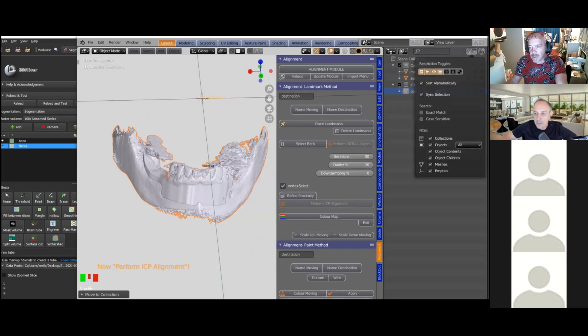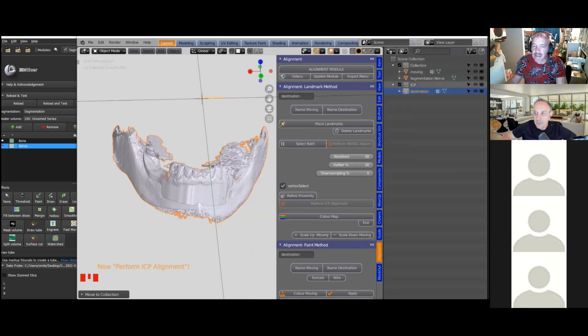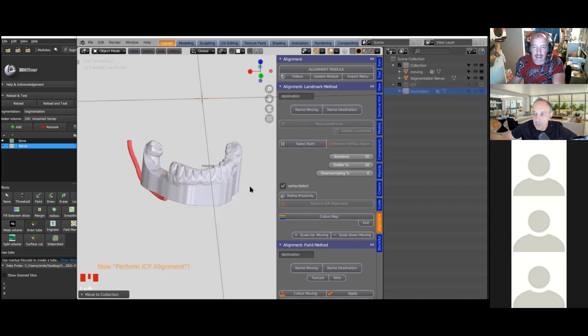But because we're thinking about the efficiency and speed of Blender all the time, this one is like 1 million vertices. That's like 4 or 5 dental models. So we need to always consider the speed of our work. I have seen people put in like 3 skulls, the same skull, but 3 times. And it was very difficult to use Blender at all.